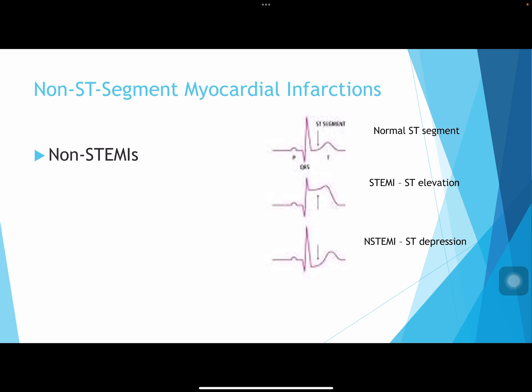You don't get those deep Q waves. And then obviously not the elevation as well. So instead, you'll notice on that third one down that you get the depression. So with NSTEMIs, you're just not going to have that gravestone effect like you would with a STEMI.